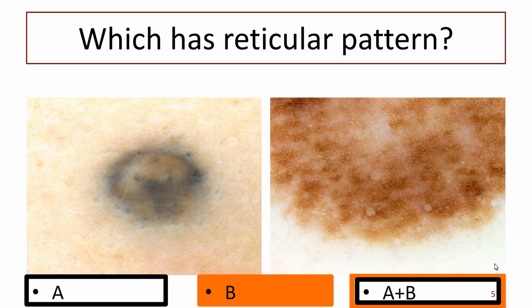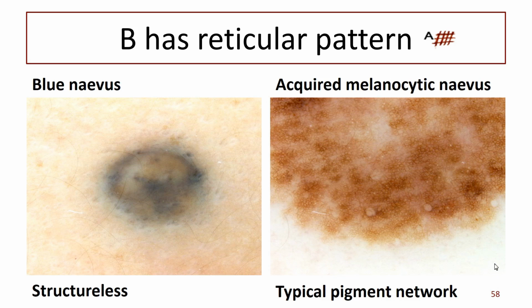Yeah, come up to the front, please do. It's a nice small group, so you can. She has drawn a grid, but that's a geometric approximation to nature that doesn't form geometry. So what I see is like a doodle. Okay, so you can have joined up circles if you wish. Yeah, it comes to the same thing. It absolutely comes to the same thing. And I think I've got a picture later on that demonstrates exactly that. Sometimes you've got circles joined up, and sometimes they're more of a grid. But they're both called reticular pattern.